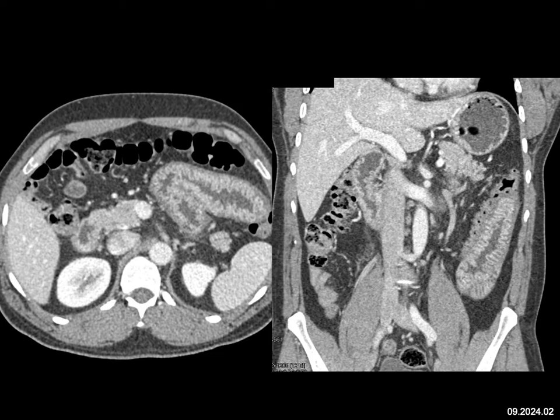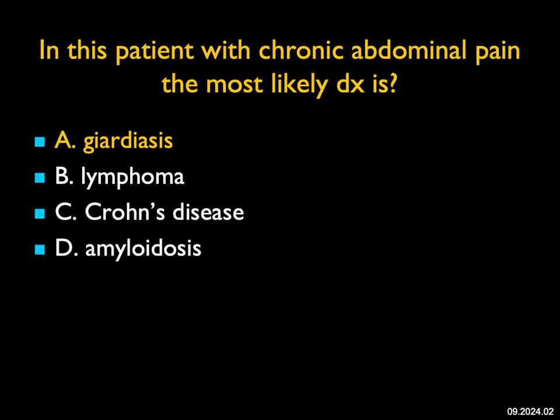And amyloid usually is solidly infiltrating without thickened folds, but kind of a more extensive involvement, often with some type of mesenteric pathology as well. This was an infectious process. This was Giardia. I showed this case because Giardia infection does occur, and when it does occur, it's most commonly in jejunum. Remember, jejunum, think Giardia. Terminal ileum, you think infection, think salmonella. TB also was terminal ileum.